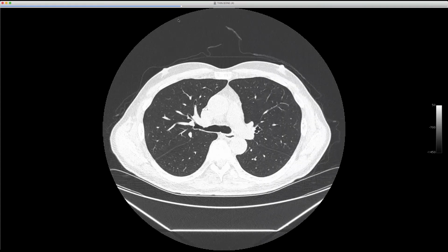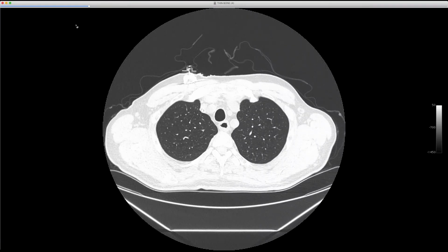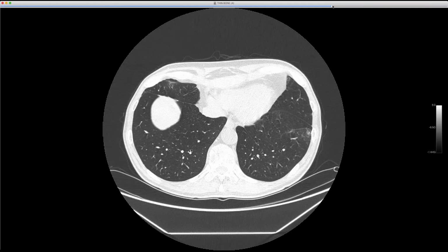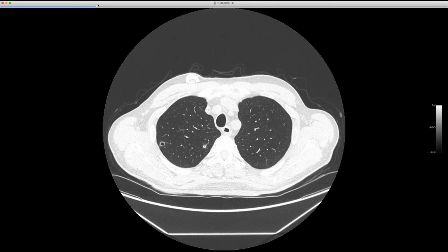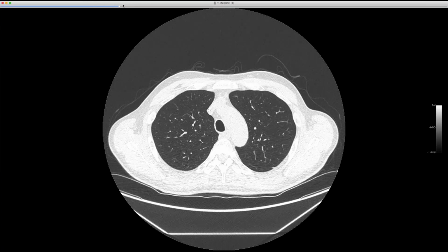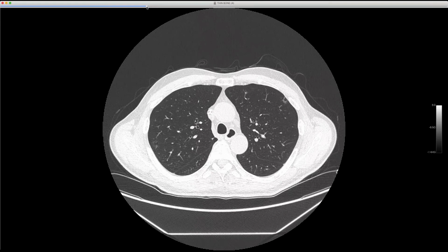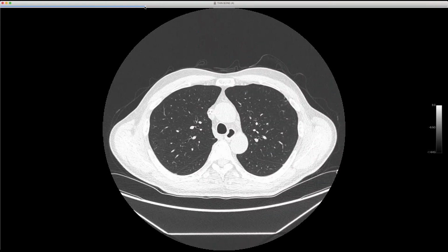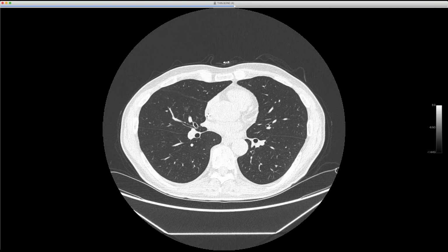So, I mean, common things being common, you'd think about metastases, but you'd wonder if this guy started smoking or something else is going on. Another CT was done almost 2 months later, and shows that these things have gotten bigger and sort of more irregular. But turns out he was not a smoker, had not done anything differently, was not using an e-cigarette, no marijuana, nothing. So obviously metastasis was a question, but it's just very unusual in that they're really in the upper zones, even had a ground glass nodule.